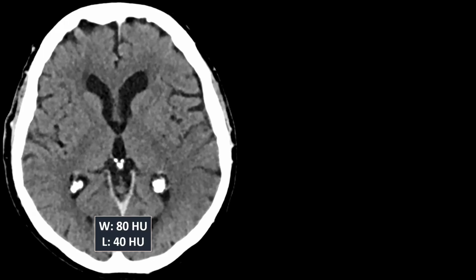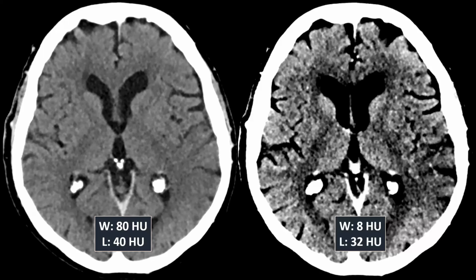And why would you do that? Because signs of early ischemic infarction can be very, very subtle. If you create a lot of contrast between gray and white matter, you can more easily pick them up. This is a brain window, and at first glance you'd say, this looks okay to me, nothing out of the ordinary. But if there's a suspicion of ischemic stroke, window the image very, very hard. This is a typical stroke window.